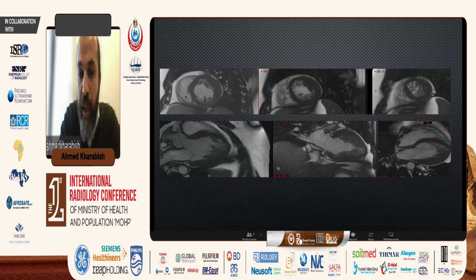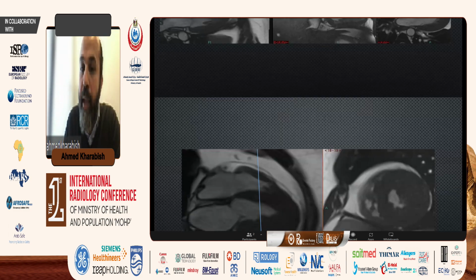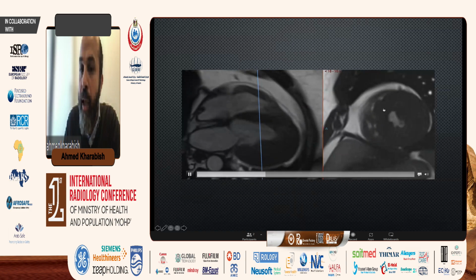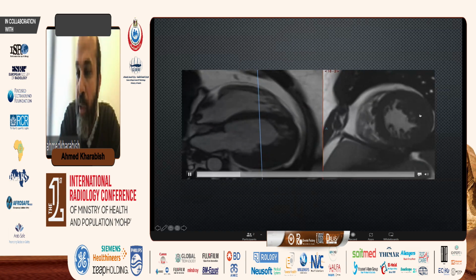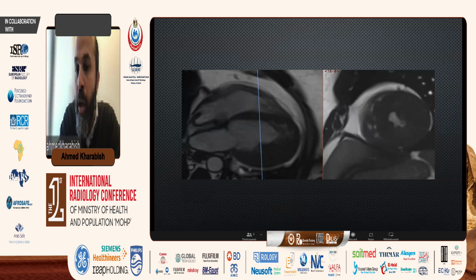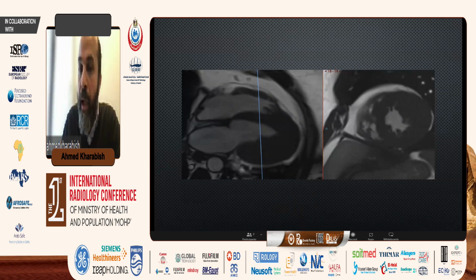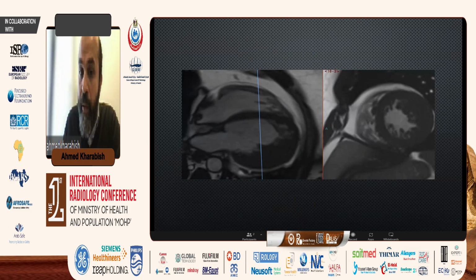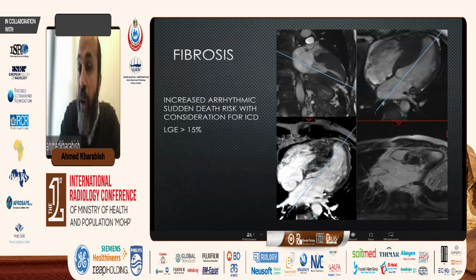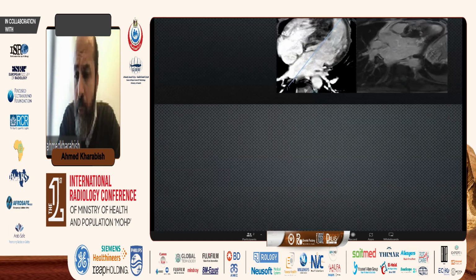Atypical HCM, sometimes we need to take care of atypical HCMs because sometimes hypertrophy is not at the anteroseptal but at the anterolateral segment. Also, sometimes it's confusing with the athlete heart, but low normal stroke volume usually is encountered in those cases. Fibrosis in hypertrophied segments is in favor of HCM and not an athlete heart.